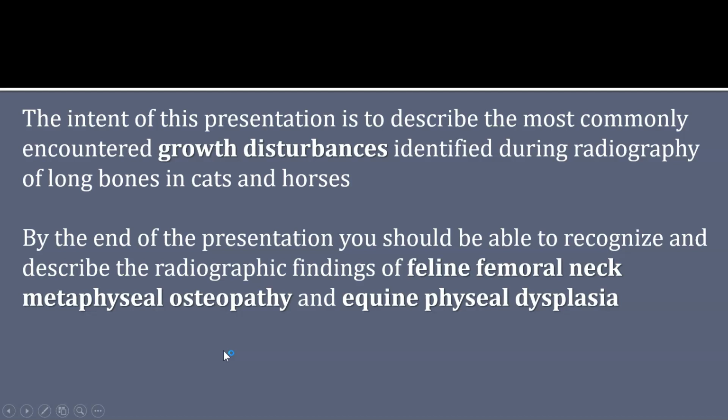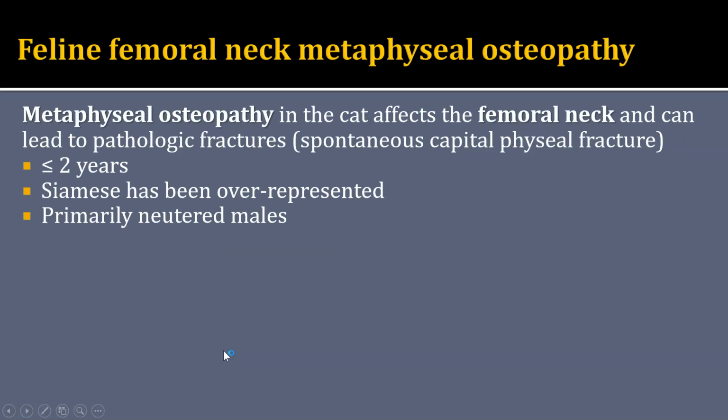So by the end of the presentation, you should be able to recognize and describe the radiographic findings of feline femoral neck metaphyseal osteopathy and equine physeal dysplasia. Let's start with the cat.